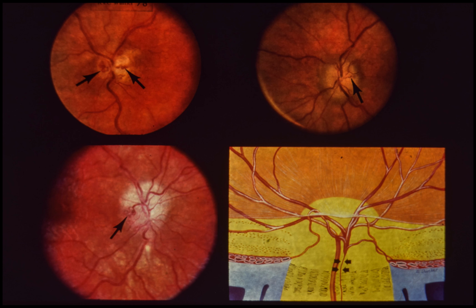This compression is most often due to a meningioma, but has been noted in patients with optic nerve glioma, optic nerve sheath cyst, and in post-papilledema optic atrophy. Upper left. This 49-year-old female developed decreased vision in her left eye 9 years previously. An exploratory craniotomy revealed an intracanalicular meningioma. Postoperatively, the patient was blind in her left eye. The left optic disc is atrophic, with narrow, sheathed retinal arteries and at least 4 optociliary vessels.